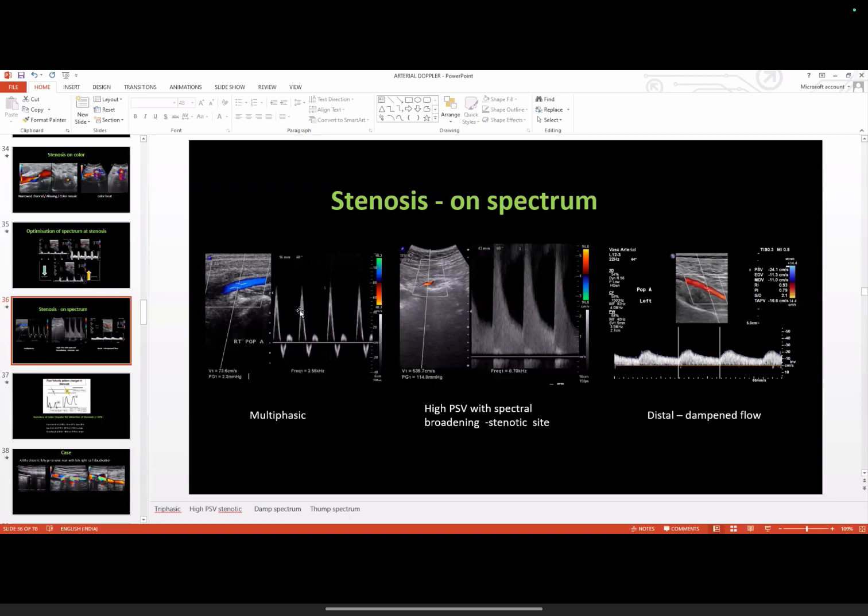So it shows that most of the velocities, at the time of this cardiac cycle, systolic peak, are mostly sampled in the center area, and they have almost equal or very little variation in their velocity. If there is 100 centimeter per second, these are between 90 to 100 centimeter per second. But in this area, the channel is narrowed and there is a post-stenotic turbulent area, so the velocities are chaotic.